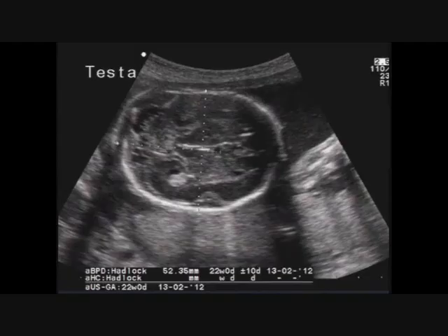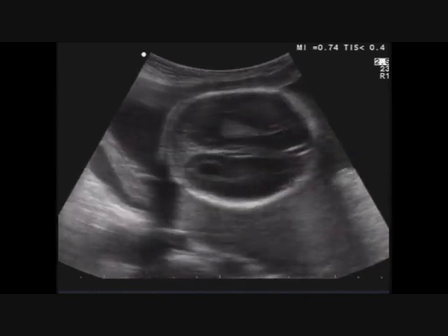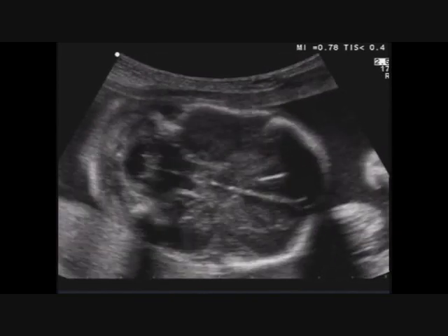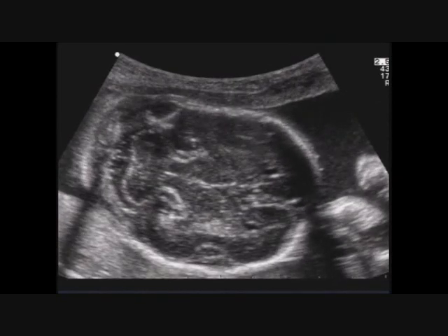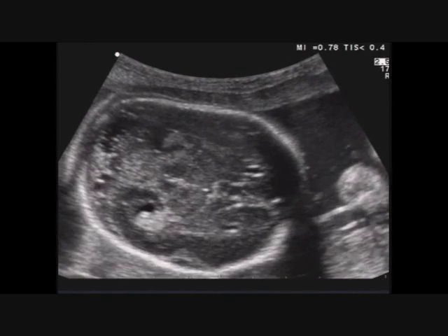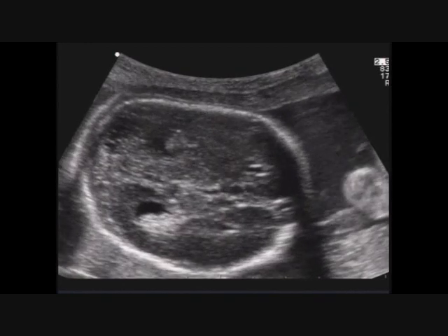The case that I bring to your observation will give us many reflections. What you must do immediately when you suspect this malformation, and it's important to stress the word suspect, is notice the absence of the cavum septum pellucidum in the median line. Then you need to do a careful study of the whole fetus. There are other signs that you can see.